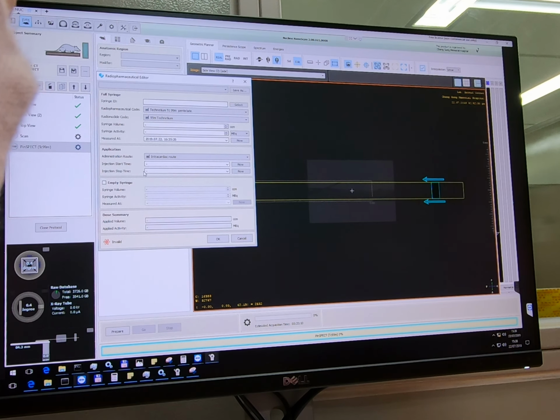But those data we put in is for the quantification? Yes. Okay. So where should we call it out? The table. Which table? The table you will just show us the pharmaceutical one. So there is a radiopharmaceutical here, and there is an add button.